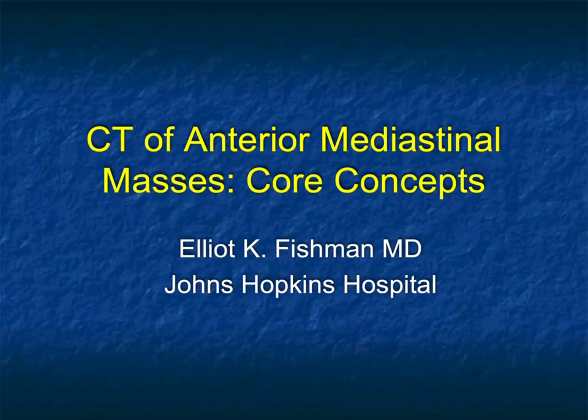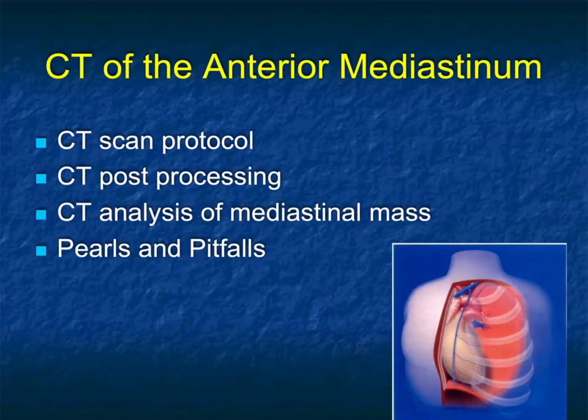And this is going to be on CT of the anterior mediastinum. This is one of the most classic topics, I think, in radiology, mediastinal imaging. We used to speak about it on plain films, and then when CT came along, CT really became the dominant imaging modality. So what I'll try to do is take you through some basic thoughts, show you lots of examples, discuss a lot of the common, mainly the common, but some of the uncommon things, and some of the findings that really help you make a very specific diagnosis.